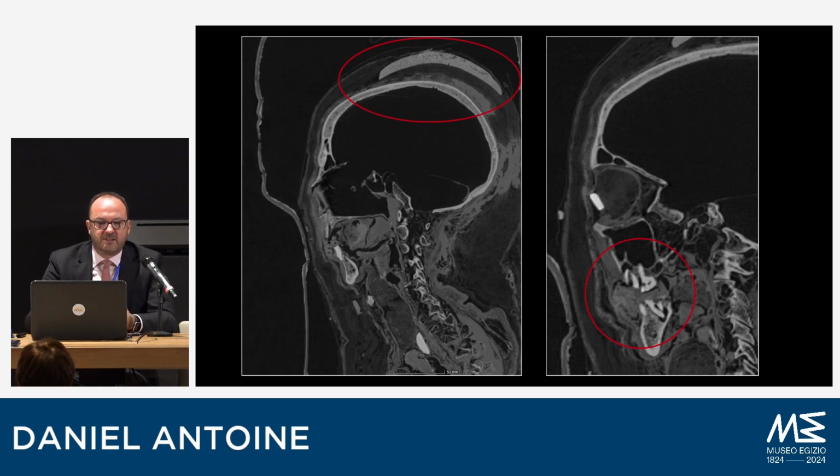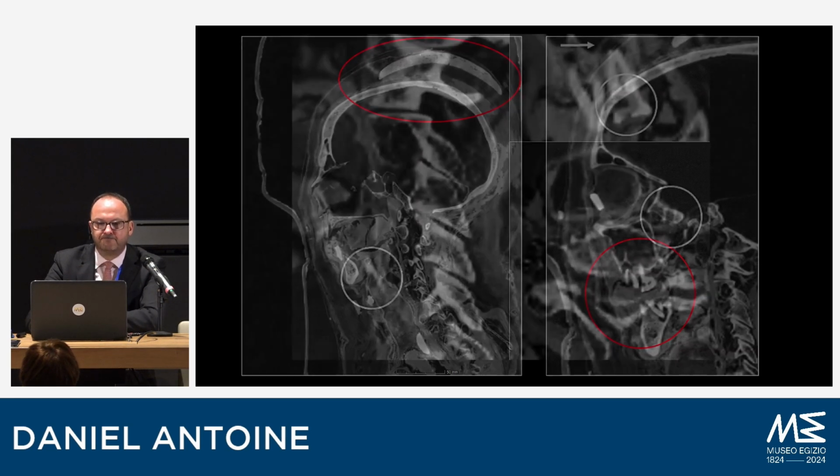And of course, we're looking at the evolution of mummification. You can see the mouth here has been filled with resin, the throat has been packed with textiles, which is typical of the Third Intermediate Period, where they're trying to preserve the features of these individuals. So as the body dries, it regains some of the three-dimensionality.